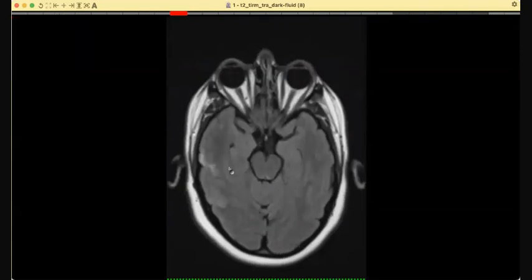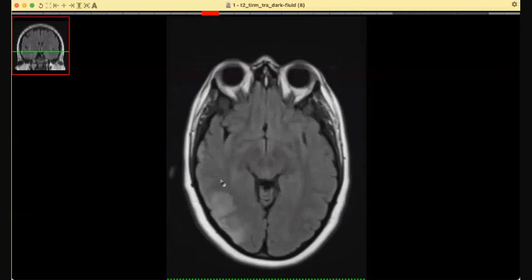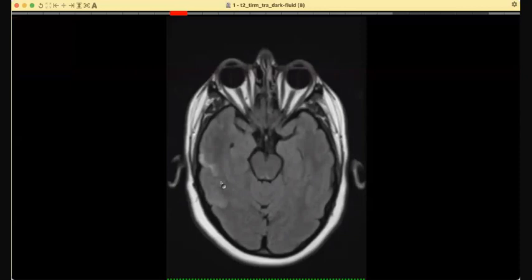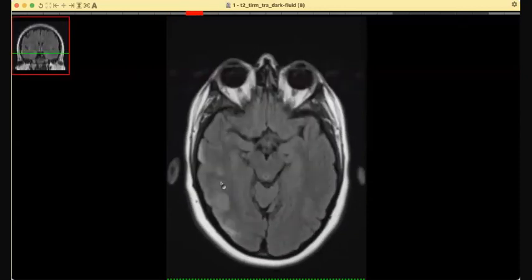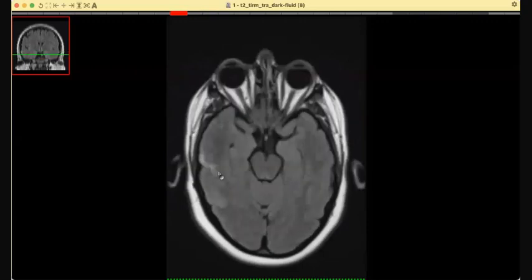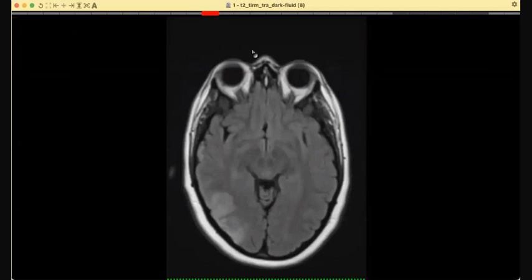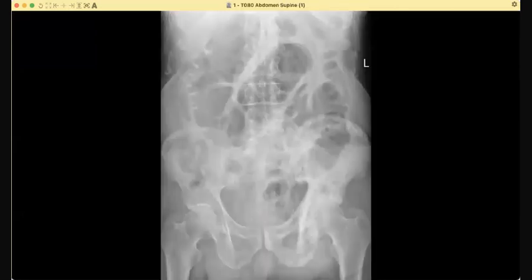This one is a thrombosed cortical vein. In this case, we did venograms, etc., which I am not showing you right now. The right-sided transverse sinus was hypoplastic. So the hypothesis is that this cortical vein was quite prominent and it was thrombosed, and because of that there was a venous infarction. So I just wanted to show you that cortical venous infarctions can also be due to sagittal sinus thrombosis or cortical vein thrombosis, and sometimes just because of cortical vein thrombosis, as I have showed you.